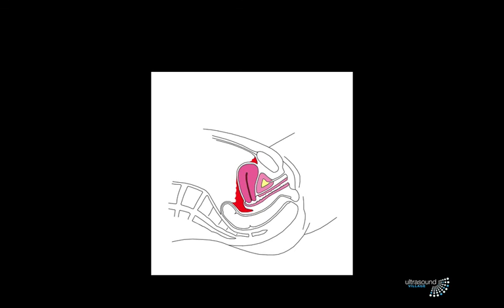But what's a bit tricky is that blood clot is grey. And when you get acute bleeding into any part of the body, you tend to get, just like if you put blood in a clotting tube, you get clot, which is grey, and then serum, which is black. And if you get acute bleeding in the pelvis, most of this will be black, but there will be bits of clot around the place.